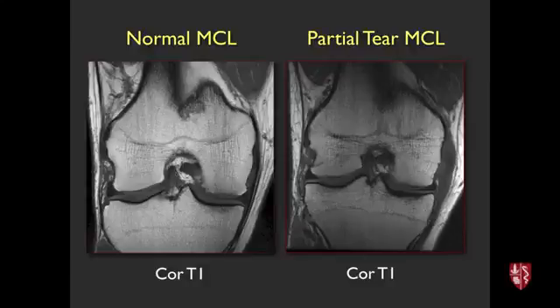The ACL in this patient is this band right here. Again, we're just seeing a slice of it, not the whole thing. The PCL's here. You can see the knee menisci are these triangular structures. We'll look at those again in a moment.